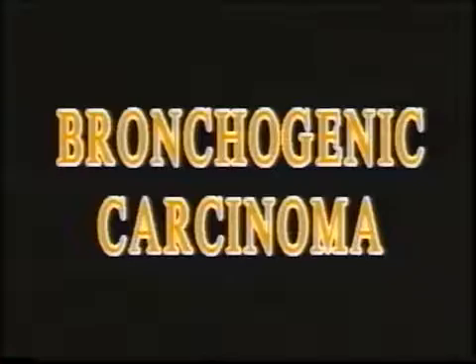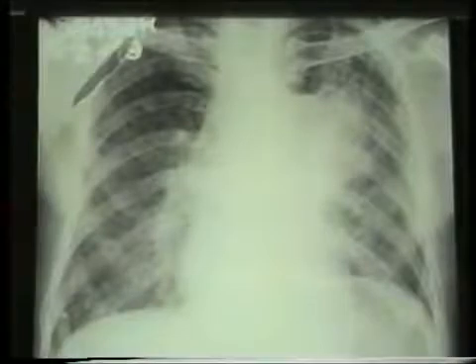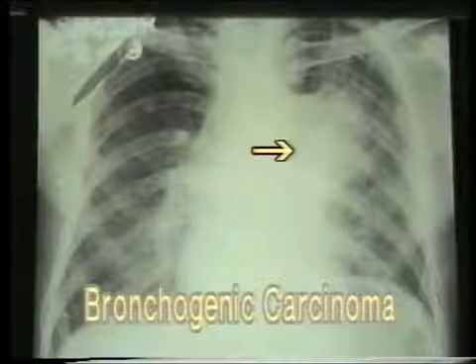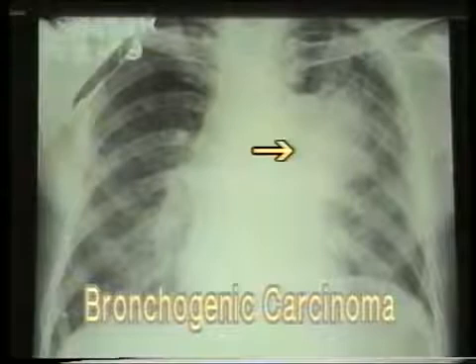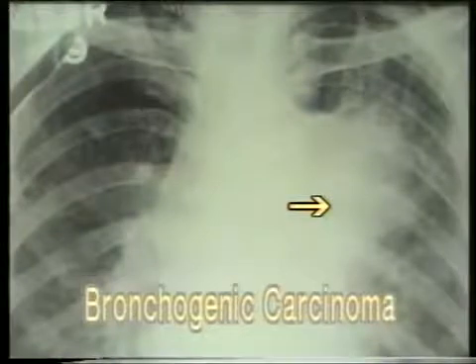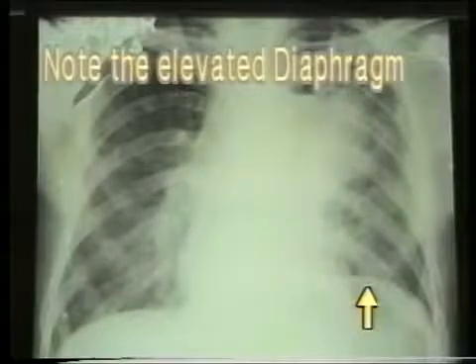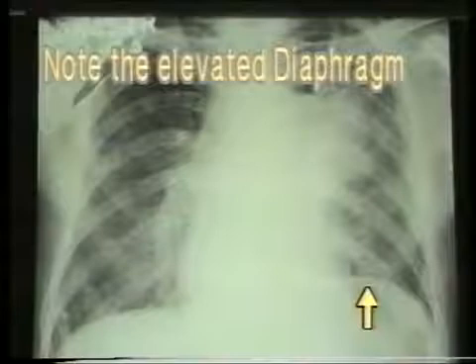Bronchogenic carcinoma. Whenever bronchogenic carcinoma is suspected, an X-ray of the chest must be taken first. A bronchogenic carcinoma arising from the main bronchus produces a dense homogeneous opacity in the region of the hilum continuous with the mediastinal shadow. In this X-ray, note the homogeneous opacity at the left hilum shown by the arrow. Note that its lateral border is not sharp, but it is spreading into the tissues. This is an important feature of bronchogenic carcinoma. Next, note that the left diaphragm is raised, indicating a collapse in the affected segment due to an obstruction in the bronchus.